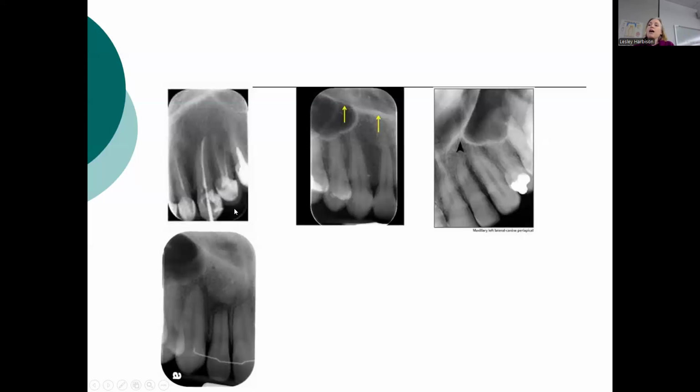This one seems to have some width to it, and it's bifurcated, whereas this is just a single, and we know our premolars can be bifurcated. So you pull in this knowledge and think critically about it, and it can help you differentiate between the anterior and the posterior on a canine shot. It takes practice. It just takes looking at a lot of images, and you'll get better at it.